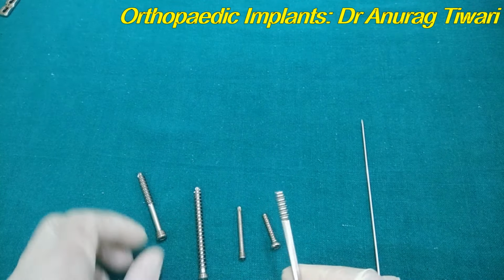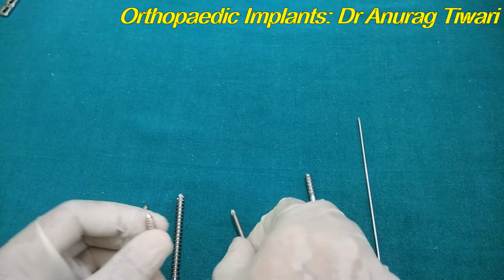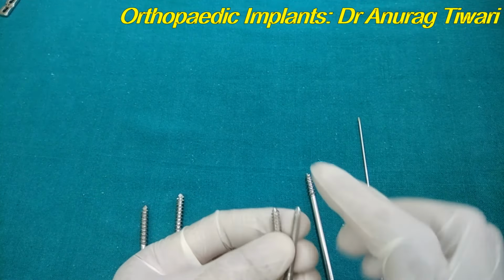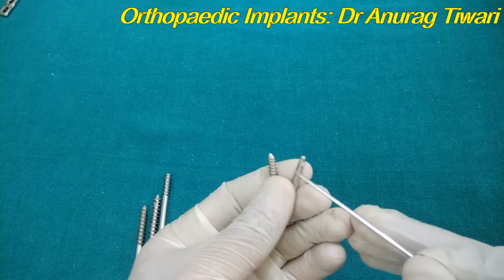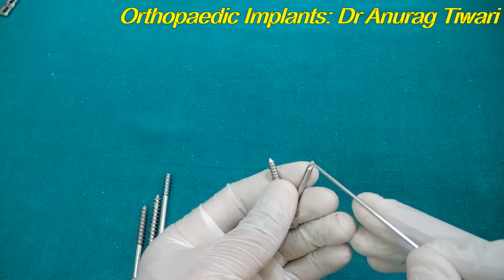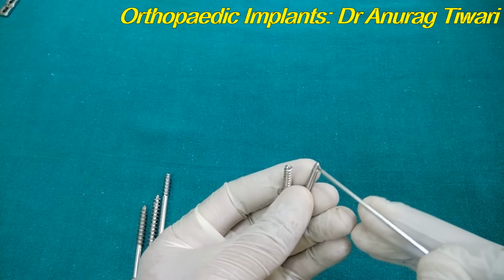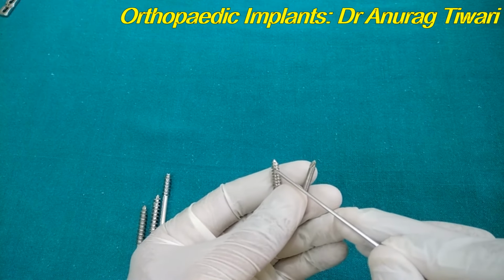So this is all about the screws. One more thing left is the tapping and non-self-tapping and self-tapping screw. Again, just see the tip of the screw. If you see this screw, it has no flute. The flute is actually a longitudinal serration. So this is a self-tapping screw, and this is a non-self-tapping screw.